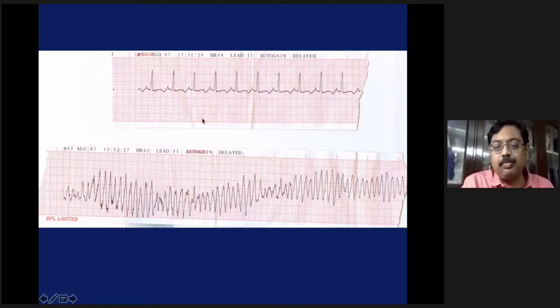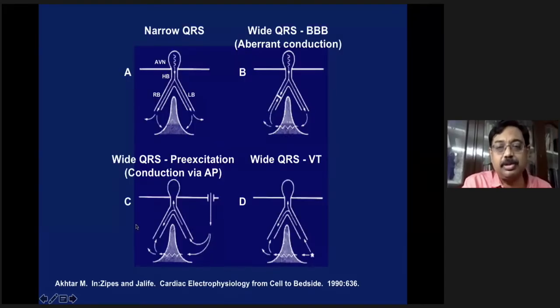So this is very important, because whenever you see a ventricular arrhythmia, the reflex is to increase the dose of amiodarone. Here you don't do that. Actually, you stop amiodarone when you see an ECG like this. So everybody on amiodarone, please keep looking at the ECGs.